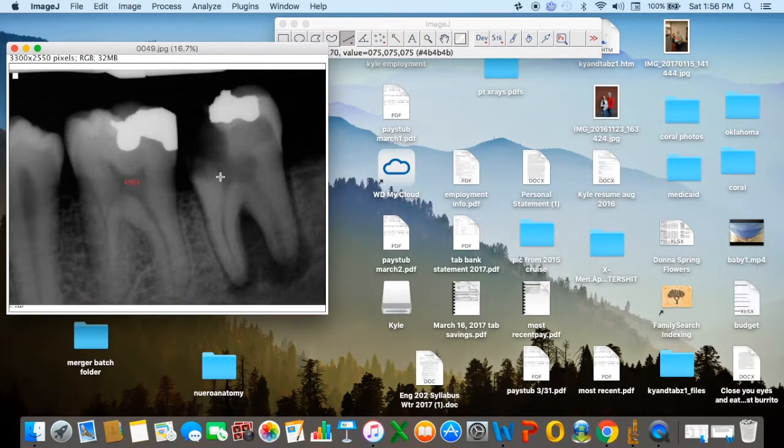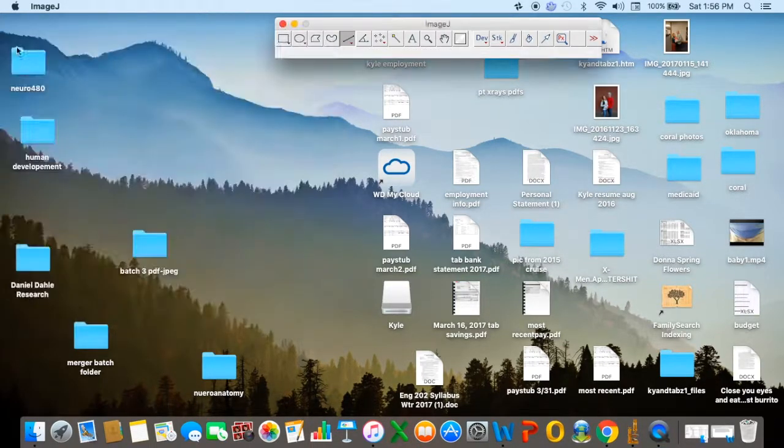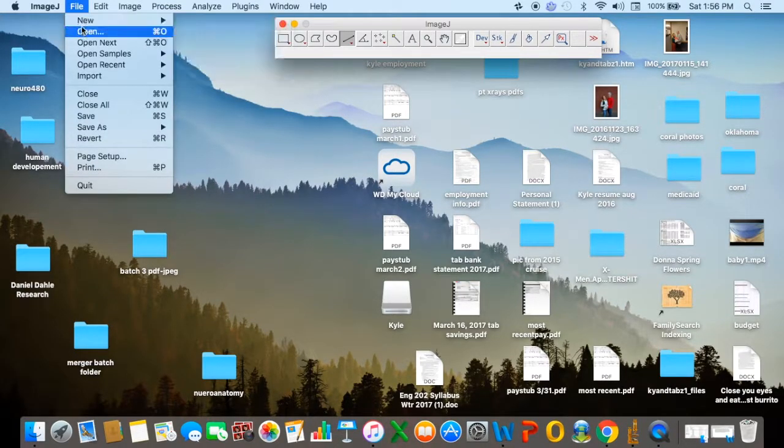In the instance of a tooth like this, where we can see that there's been a definite abscess and some infection through this bone loss around here, we're going to take these out of our measurement, because this inflammation and this sort of loss of the joint is due more to infection. So I'm not asking you to diagnose a root canal and an abscess, but if you see an extreme case like this, just make note of that, and we're going to put INF for infection. Okay, so there's that example.